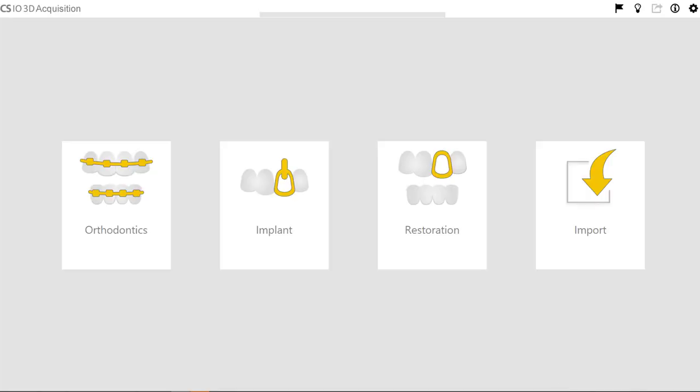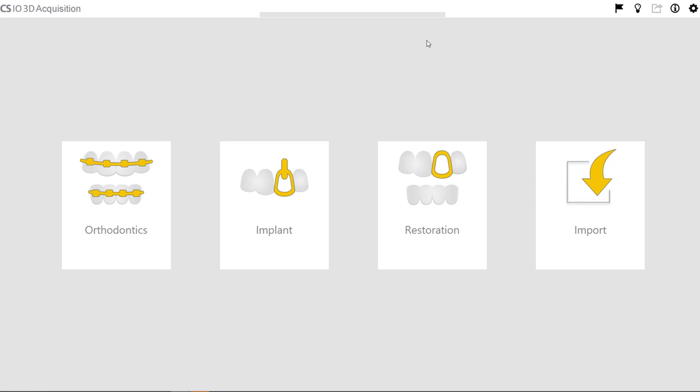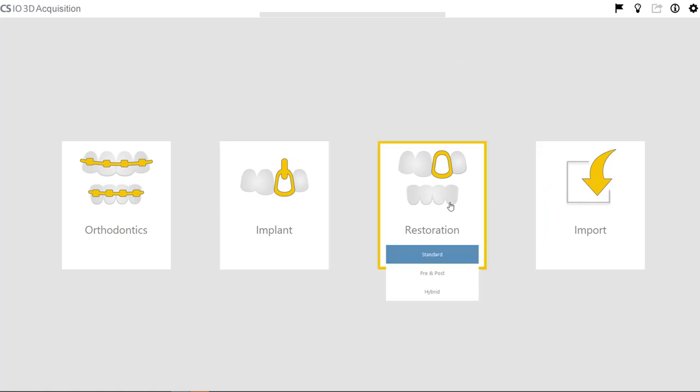Hey, this is Corey Glenn, and I'm going to show a video today of how you could go about making a flexible partial. So a lot of times, in temporary situations or maybe just as a low-cost option to replace some teeth, you're going to need the ability to create some kind of a flipper. So that's obviously something you could have lab made.